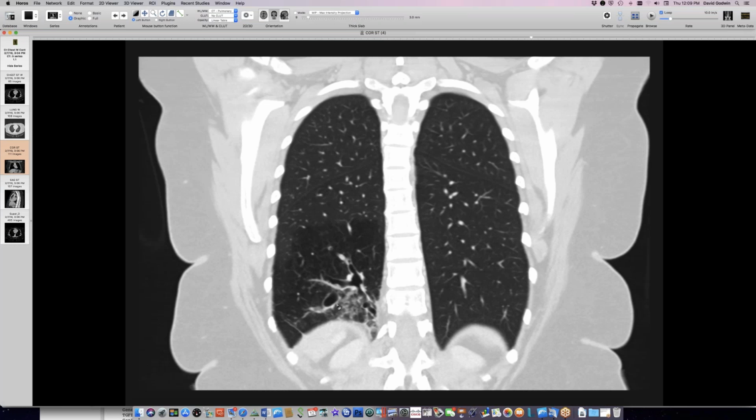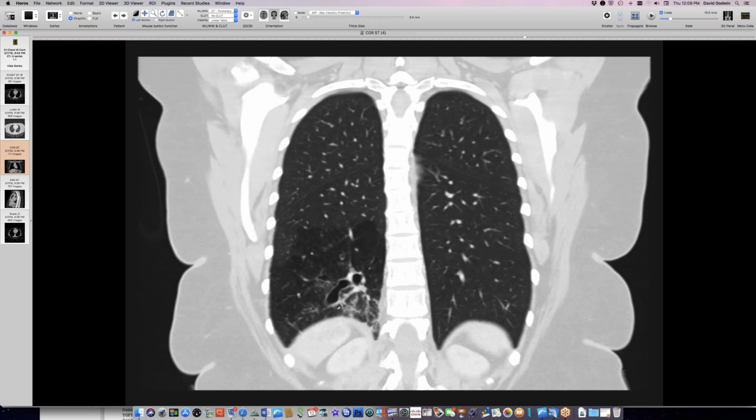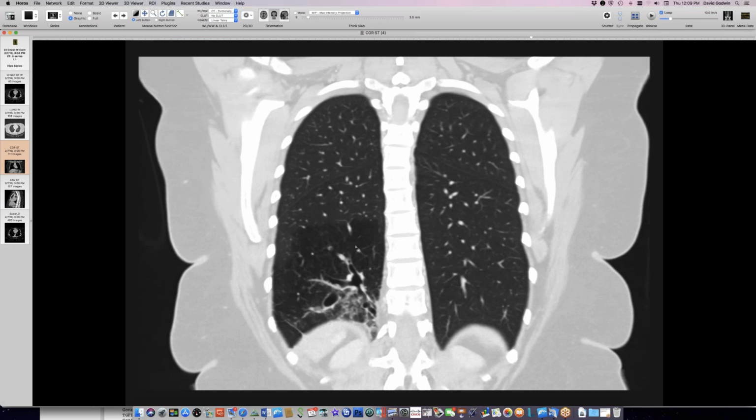Right. Okay. I mean, they didn't describe any CPAM-ish stuff. And I've seen this emphysema surrounding a more central dense nidus before. I don't know what to make of that. So, yeah, if you wanted to call it CPAM, or even congenital lobar emphysema, which doesn't have to be lobar, and it's now called overinflation, that would explain the big patch of emphysematous looking lung. But you mentioned they saw cysts, and that's with the Stocker ones. They see macroscopic, or they see big cysts in the lung specimens. I think some of it may just be semantics.